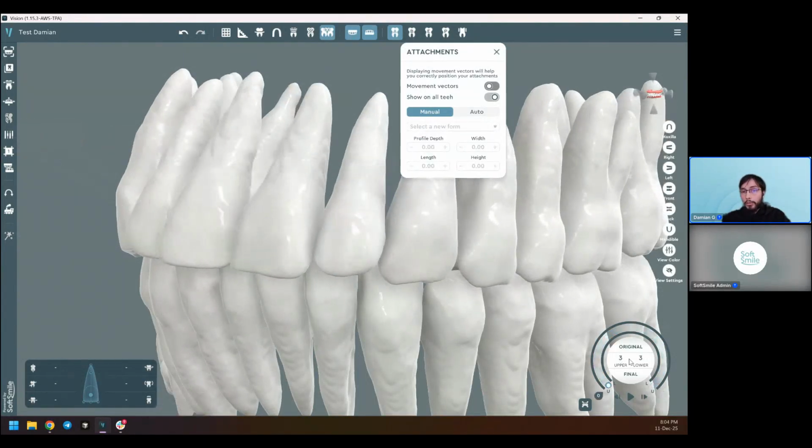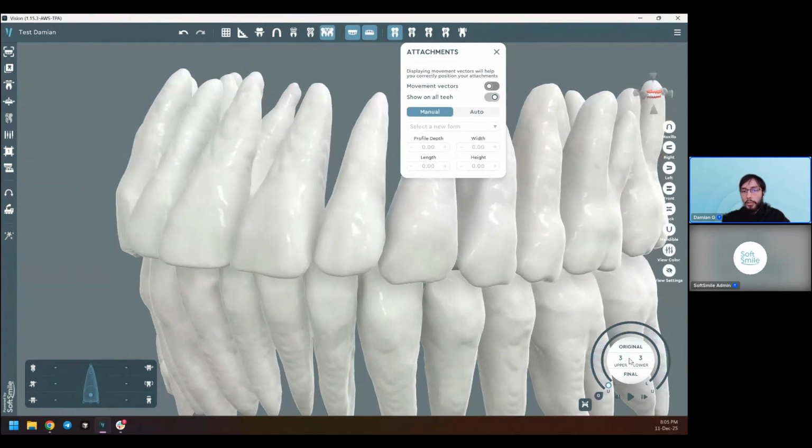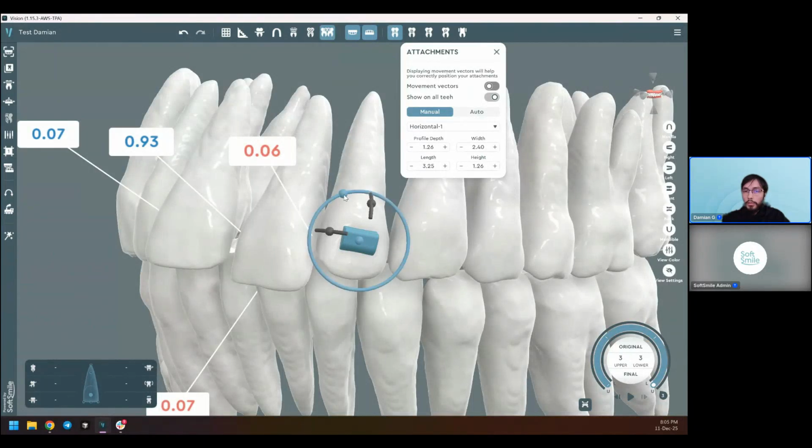Traditionally, I would look at how the tooth is moving and figure out, okay, so it looks like there is a rotation here, and I'll probably rotate it 90 degrees to turn the edge over there. But this is mainly based on my intuition. I'm doing that more or less blindly. Therefore, there is a problem, right?